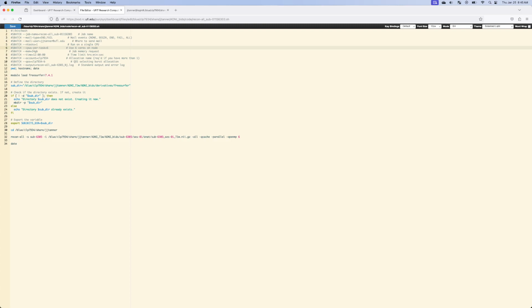And so this is requesting 6 cores, and basically like 6 CPUs to think of, even though I said a single CPU, but a little bit different setup here. So this is 6 cores, think of it that way. I'm going to request 24 gigabytes of RAM. That's about 4 gigabytes per core, which should be sufficient for this. How do I know that? Trial and error on my part.